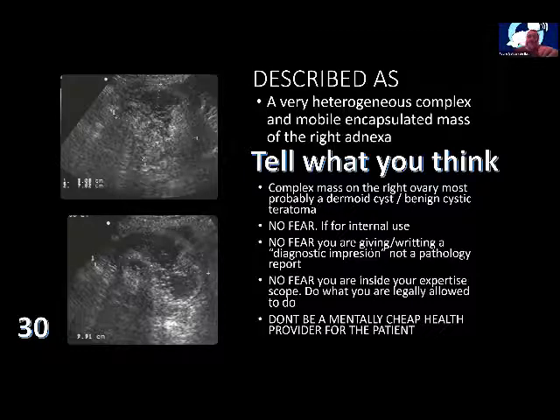This was described as a very heterogeneous, complex, mobile, encapsulated mass of the right adnexa. So in the final report, I said, this is most probably a dermoid cyst or benign cystic teratoma. You're not a pathologist, but you know very well how a teratoma looks.